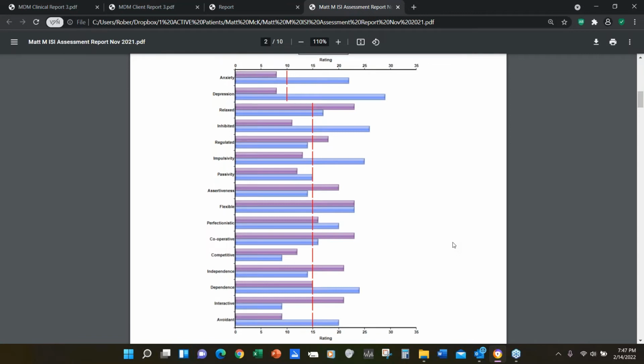I mean, everything here is a tool, and its accuracy is improved or degraded to some degree by whether it's applied appropriately. You can have a bad map and say, well, a lot of this delta in the map is eye movement and stuff, and I know that, but the rest of the map is accurate. So we're going to discount this delta. We're not going to rule it out completely, but a lot of this is just artifact. But the theta and the alpha are accurate, so we're going to look at that in the map and pay more attention to that.